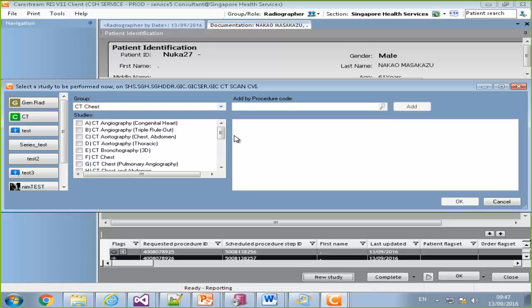But since we're now in documentation together state, there are a couple of scenarios. Just think about it: if we're adding a study that is in the same group, there is a question whether we want to add it to the current form, to copy all the data to it also, or on the other hand, open it in a new form, like in the old version.